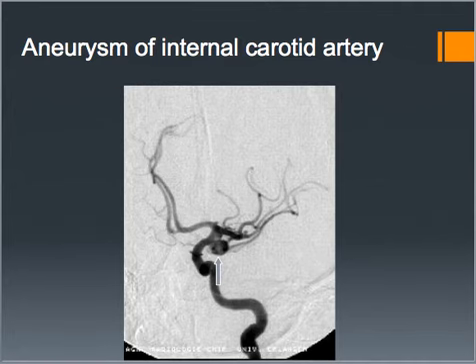This is an aneurysm of the internal carotid artery. So you can see here the contrast coming up, and then right here, see this little round ball? This is the aneurysm. Remember I said the wall lining weakens, and then it's like an outpouching there. When the blood flows up in here, it goes into that aneurysm and doesn't necessarily flow back out, so it stays in there, and it puts pressure on that wall of the artery, and that's what can actually cause it to rupture, the pressure of the blood.